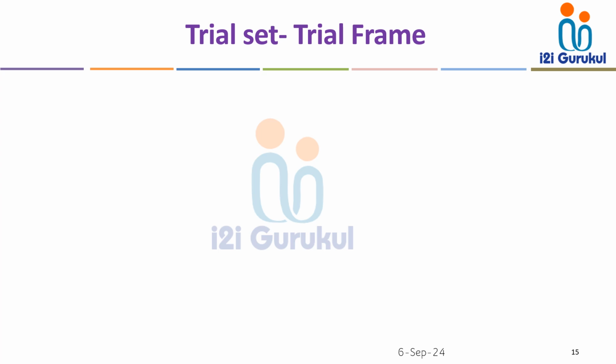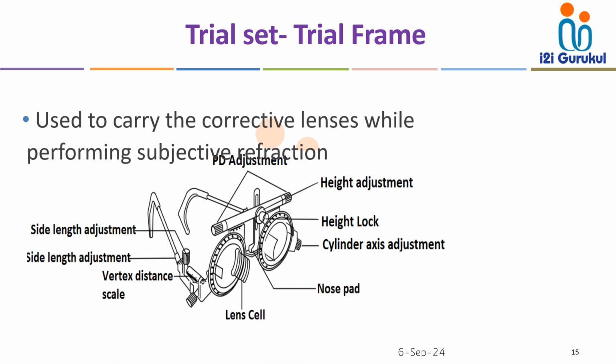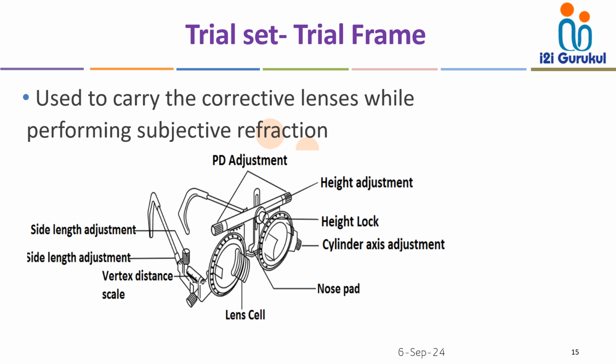Friends, coming to the next accessory, that is the trial frame. In day-to-day practice, we use the trial frame for refraction purposes, and we have many compartments in the trial frames. A trial frame is an adjustable spectacle frame.